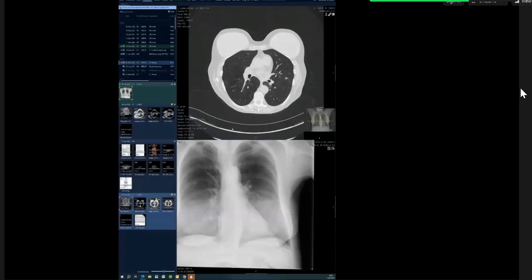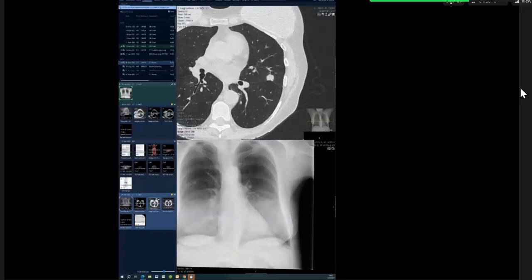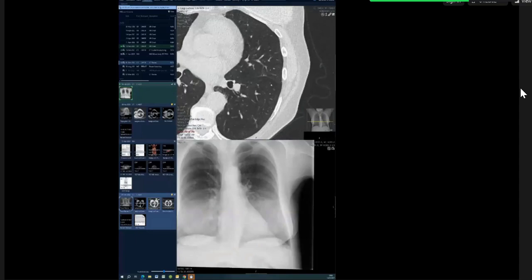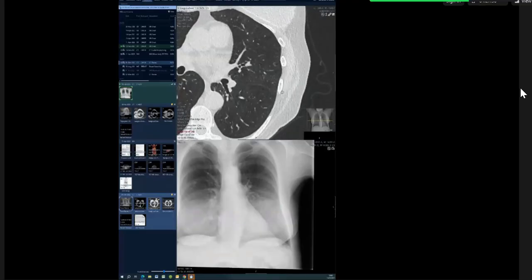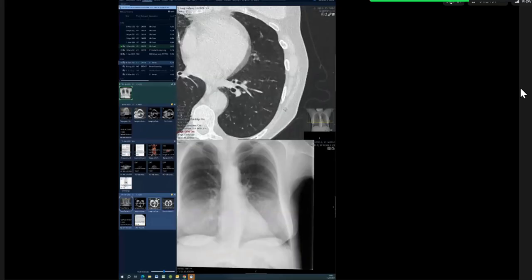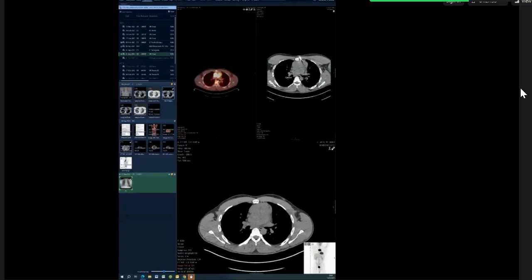And that's here again. You said all the right things, but you didn't say them in order. And I think that was more nerves. So if you say solid nodule, spiculated margins, then you have to say what it is doing around it. You have to say tethering of the pleura, suggesting malignant pathology. Then you have to say no cavitation, no calcification, and so on. All of those things you did, but they went in a haphazard pattern. But I think this was a strong pass, this case. And the last one also, I think you didn't get all the points you should have gotten because you knew it. You didn't want to offer that information for some reason.